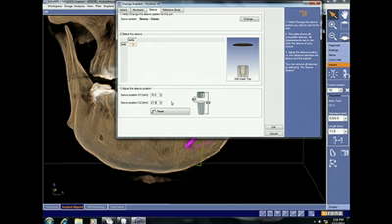And what we have to understand is what drills we have available, knowing that we're using an Astra implant. Well, Astra implant drills come in the sizes of 14 millimeters, 18 millimeters, 22 millimeters, and 25 millimeters. My preference is to use the 22 millimeters in this clinical situation, and so I'm going to set my D2 sleeve position as 21 millimeters.